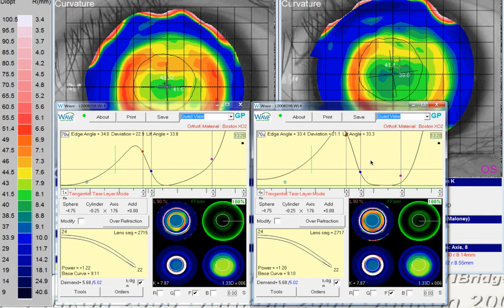So here now on the right side, I have a proposed lens for the left eye. The lens on the left side here is the lens that the patient's currently wearing. What I did was I moved the IC control point out to 7.2. I also moved the OZ out so we don't have a really, really large reservoir of fluid where the reverse curve starts. So this is at 6.2, 7.2, and then I adjusted the topo demand. I did have to bump that up, and we are at 70 microns there to maintain the same topo demand.